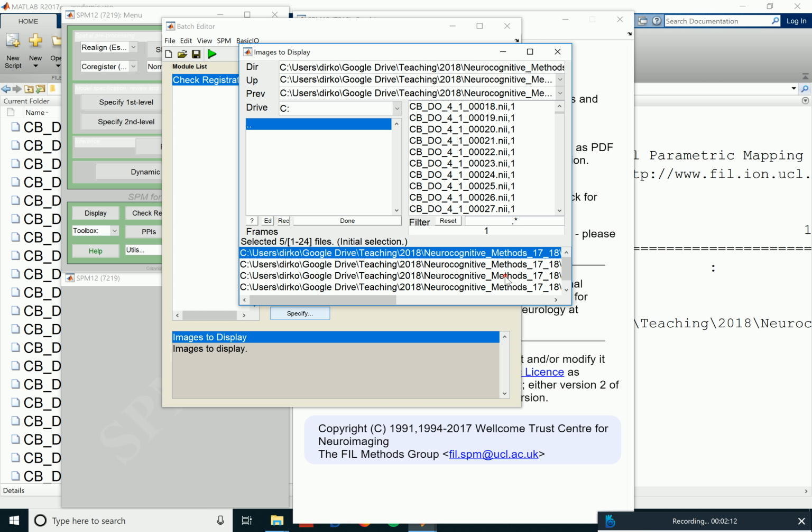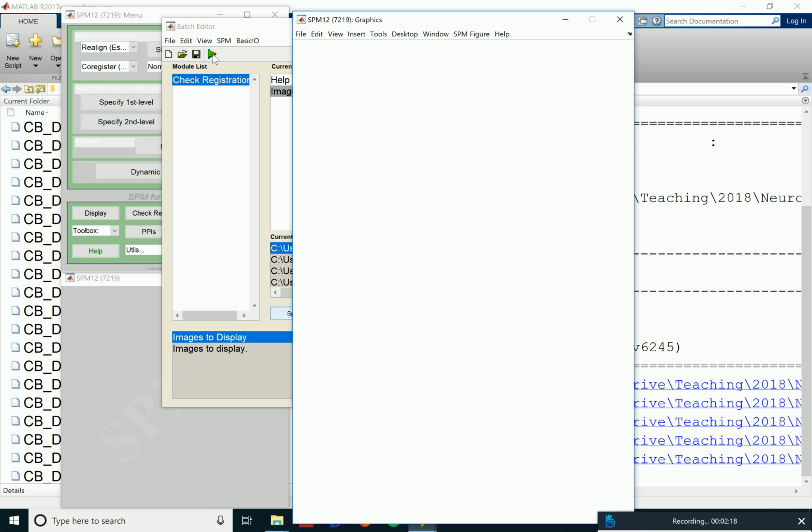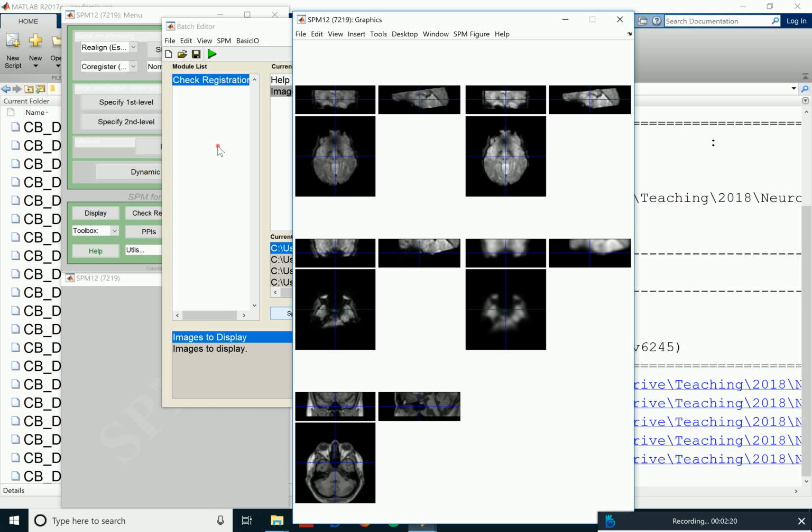Another one. Done. So, and again, you could write a script now based on that.